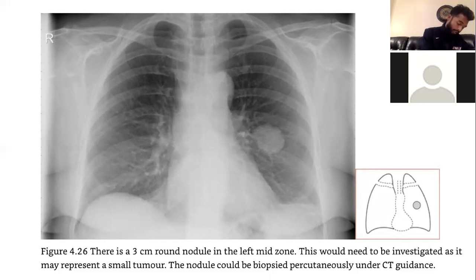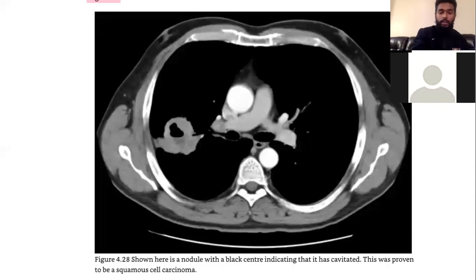And then look for lymphadenopathy. And sometimes if there's something going on here, look at areas distal to it, because in this one I think there are fewer vascular markings, or it could cause collapse distal to that area. That's basically it.